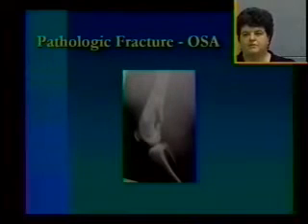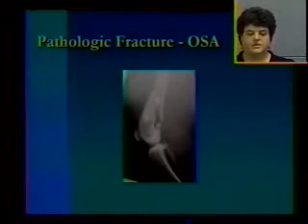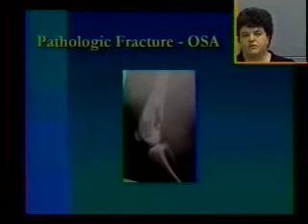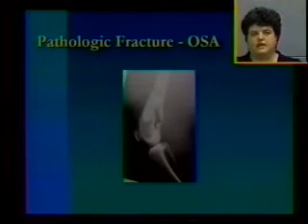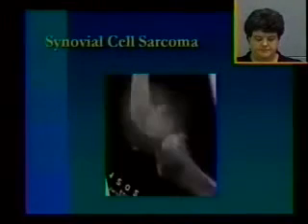What's important to remember is that this question is given to you on the NAVLE examination, and they expect you to decide what to do next for this dog, whether to put a plate on this dog or to recommend amputation. You need to have looked carefully in order to detect the increased bone and the areas of osteolysis in order to come to the correct answer, which is amputation.